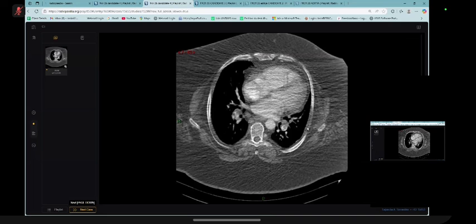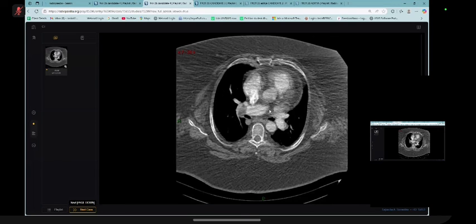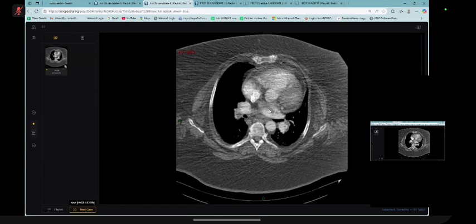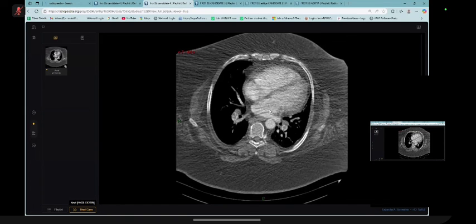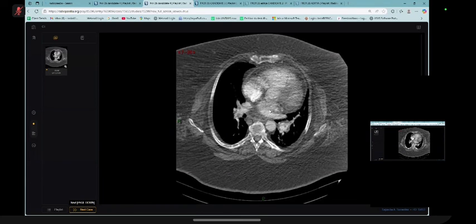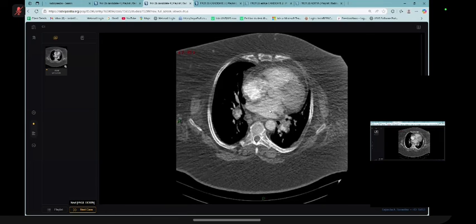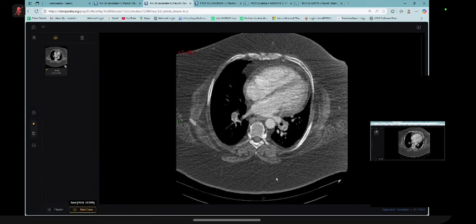So the diagnosis should be like that: there is acute pulmonary embolism involving these pulmonary arteries, and there is a right heart strain pattern or no strain pattern, without any associated lung mass lesion or infarction. I would like to immediately inform this finding to the referring doctor and arrange further management like anticoagulation and consideration for vascular team referral. You are not saying what to do, like embolectomy; the vascular team will decide. So this is the endpoint for us.